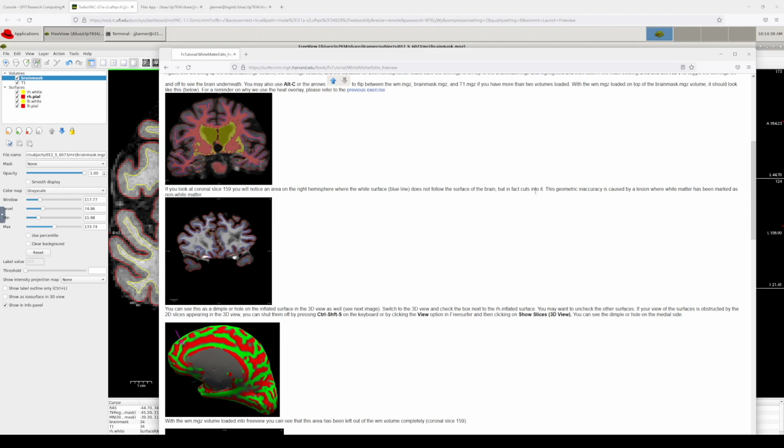And so again, it's saying the cortical surface, that little red dot right there, but the blue is denoting the gray-white boundary. And that is saying that's the end of the white matter, and so it's causing this hole in the brain. And you can see that on a cortical surface there.